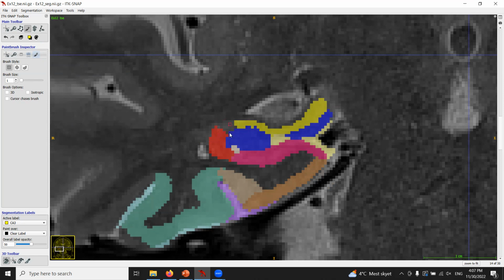And since the CA2 label is missing, and it's generally of this size, I'm guessing the biggest portion of this gap is CA2, but that I would recommend reading the protocol and filling it in. I would not recommend changing anything of the label that was already there. So I would keep it as is, but just add the label according to the protocol as well as possible.